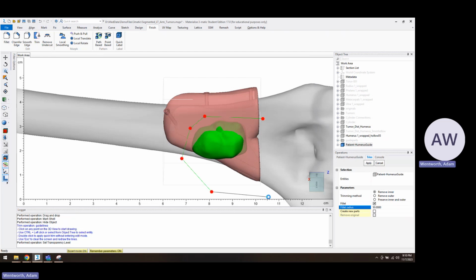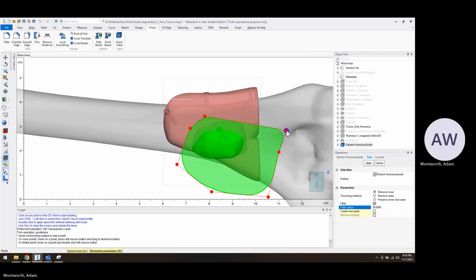and then just surround this part basically. And you'll see the preview of how that guide looks. And you could drag points out if you want. Making sure you give enough area for that saw to kind of follow the flat side of the guide. And I'll click apply.